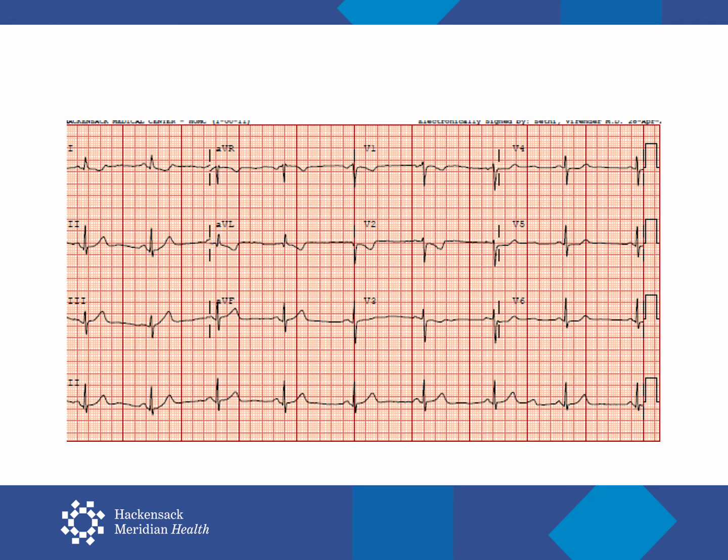This patient presented with jaw pain and dyspnea, had no chest pain. The tracing shows a very subtle form of what we were just seeing more dramatically. This is an early, true posterior MI. V1 and V2 have T-wave inversions, which will progress to ST segment depressions.